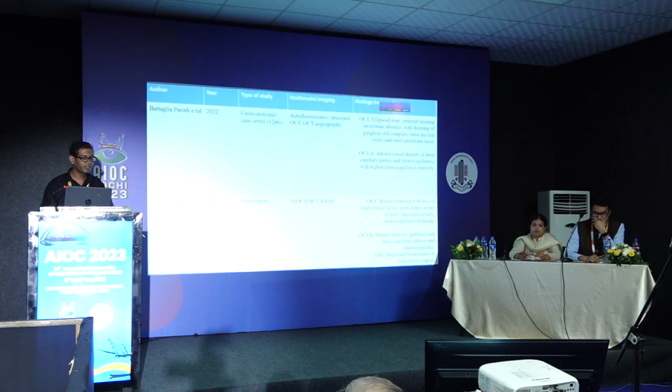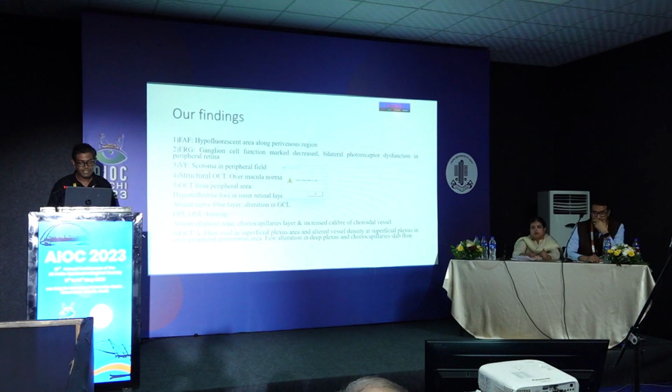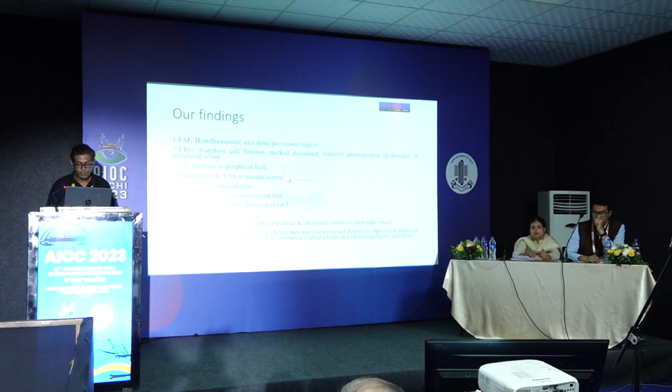These are studies which were conducted, which state the importance of multimodal imaging in PPCRA cases. Mostly in OCT-A findings, a previous study suggested altered vessel density in the deep capillary plexus and choriocapillary region. And in this study, Ratnesh Ranjan suggested normal flow at the superficial and deep capillary plexus and choriocapillary. But in our study, we found flow void areas in the superficial plexus and altered vessel density also, and a few alterations at the deep plexus and choriocapillary slab.